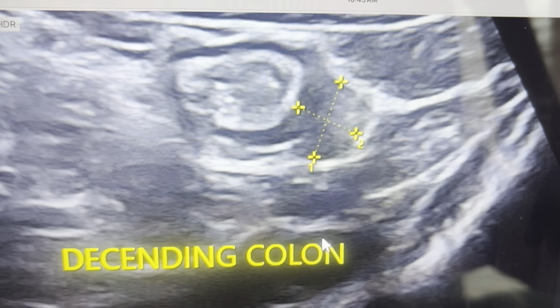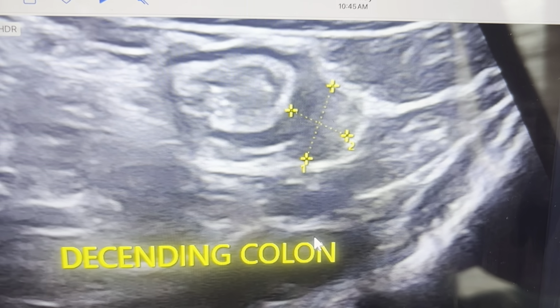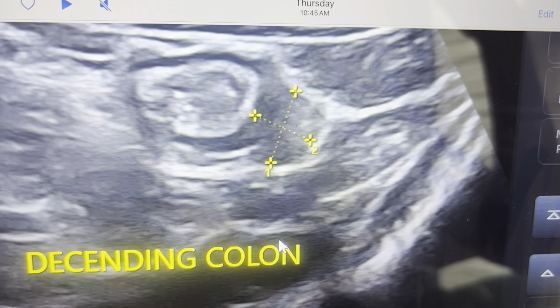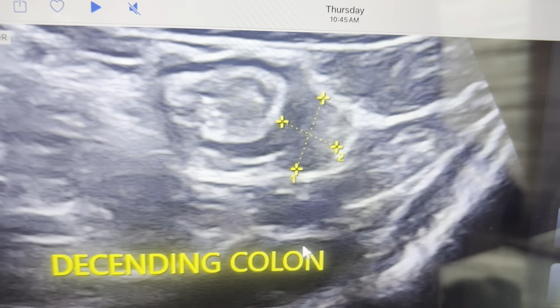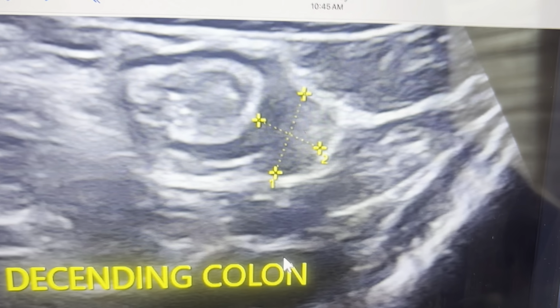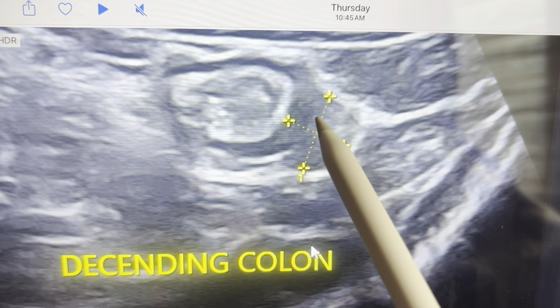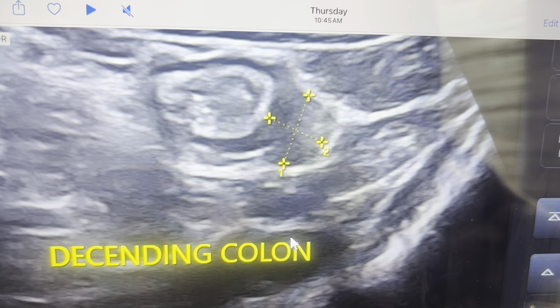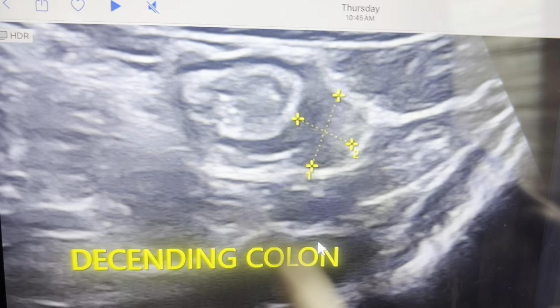The basic fundamental of ultrasound says that whenever any soft tissue is inflamed, it becomes waterlogged. There is water aggregation in the cells. So the more the water, the more hypoechoic it becomes. And in a simple cyst, we see only water fluid, so it becomes anechoic.